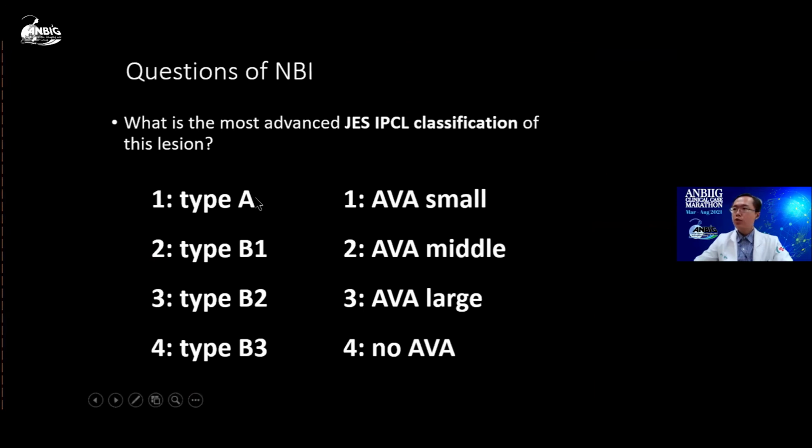So my next question for the attendees is, what is the most advanced IPCL classification for this lesion? Please vote. The first one, type A, B1, B2, or B3.